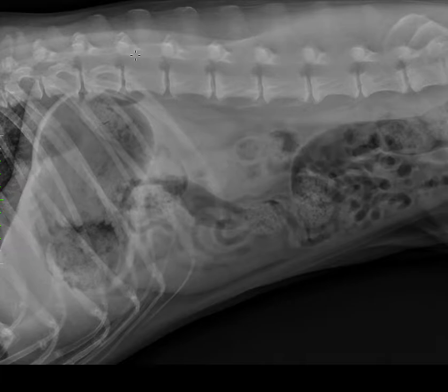Of course, that doesn't stop us from assessing all of the organs, but in general, I think that the goal of this study is to determine whether there's a gastrointestinal lesion that could be causing what is being interpreted as nausea in this patient. So, for cases like this, I like to start by looking at the stomach. Here on the right lateral view, and we have 2 right lateral views for this case and no left lateral view. I'll talk more about that in a minute.